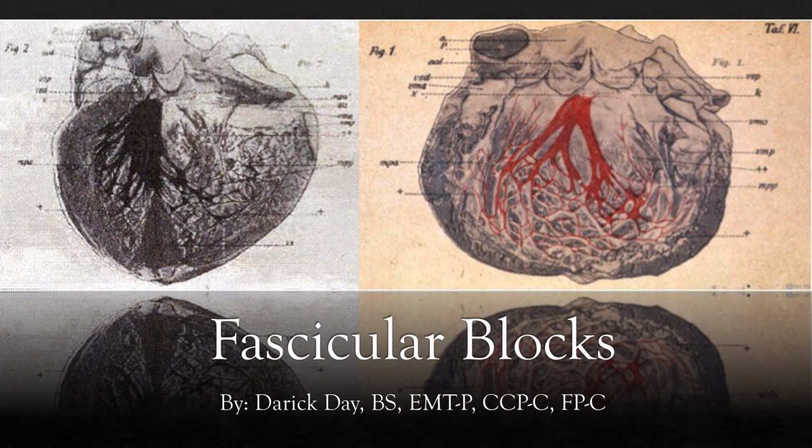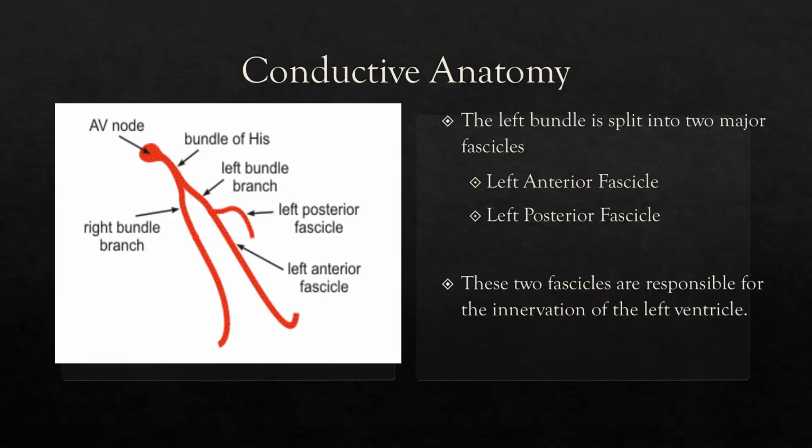All right, on this episode, we're going to discuss diagnosing fascicular blocks on the ECG and talk just a little bit about their clinical implications. Okay, so everybody's favorite part, we got to go over anatomy real quick. So just to review, so we're all on the same page.